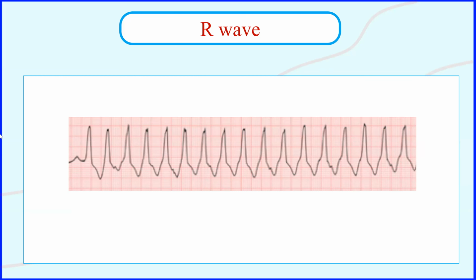While this EKG here shows that these QRS complexes are really weird. And if you can see, they are almost 4 or 5 small squares, indicating that this is a broad complex tachycardia. And in this case, we suspect that the focus is coming from the ventricular muscle itself, and this impulse is not following the normal conduction pathway. And actually, you can simply diagnose the patient with a ventricular tachycardia that can be fatal.